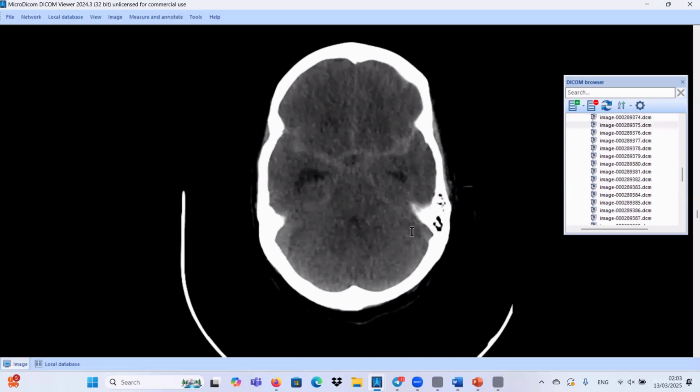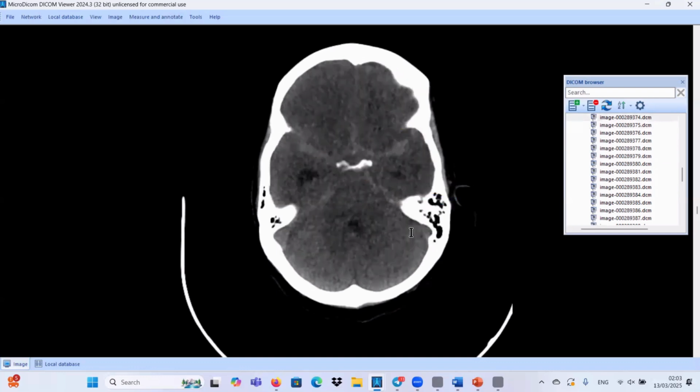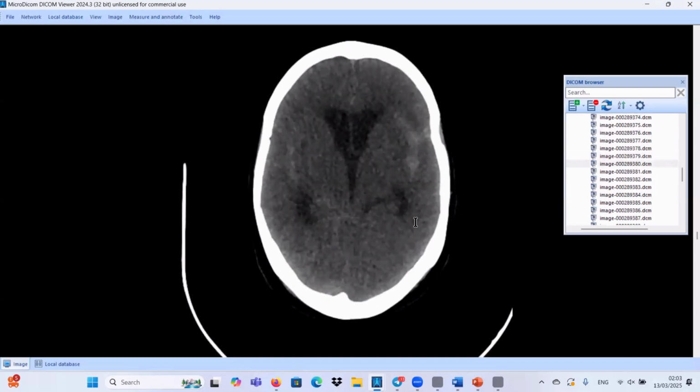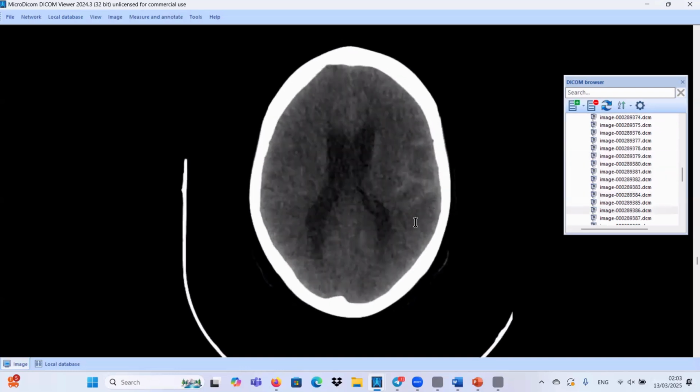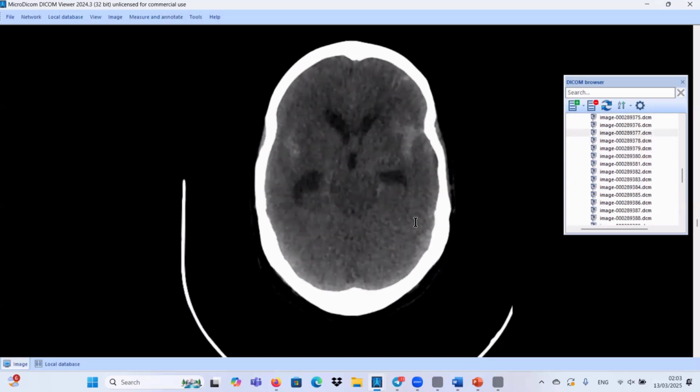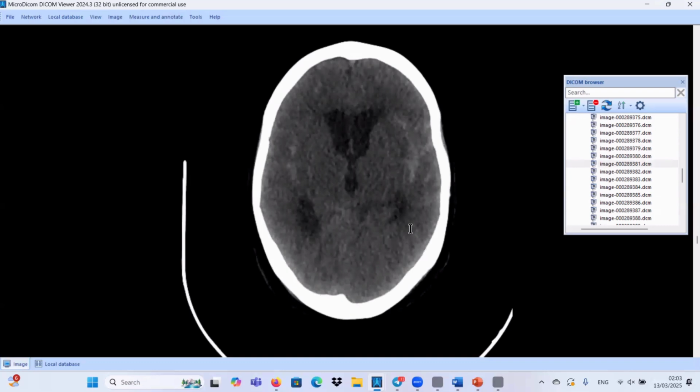Inferiorly, the subarachnoid hemorrhage extends along the basal cisterns of the brain, and to a lesser extent extends along the interhemispheric fissure. Once we have subarachnoid hemorrhage, we should grade its severity. Please watch case number 6 in our course, on how to grade the subarachnoid hemorrhage by the modified Fisher scale. I will not repeat the same data again.